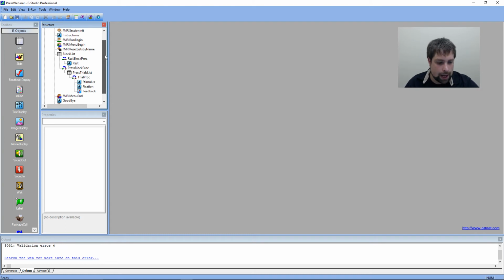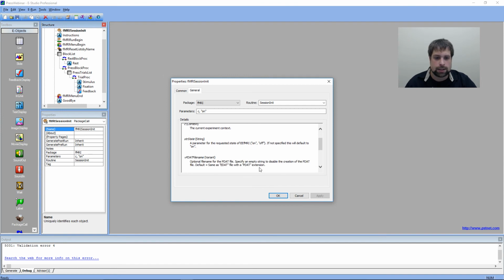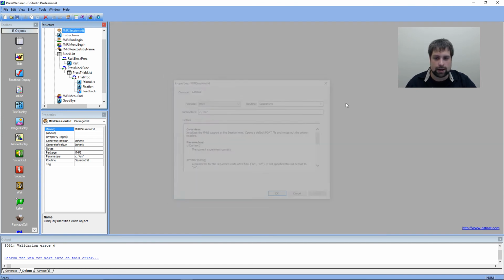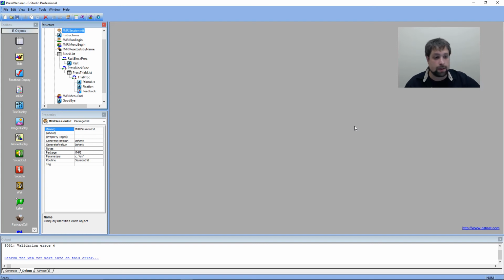All right, so now that I have all of my lists set up, I want to actually start building up what my PDAT file says. So my PDAT file right now, if you look at my session init here, it's just going to add the very basics of my PDAT file, and that includes onset time. So what time was the sample taken? Target onset time. What time was it supposed to run? Runtime. So how long did it run for?